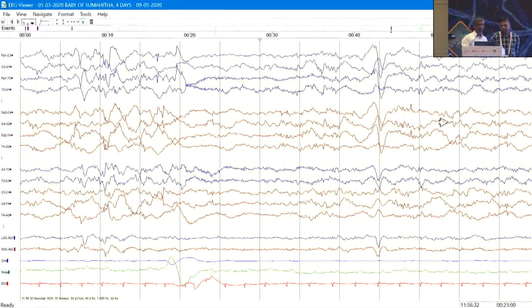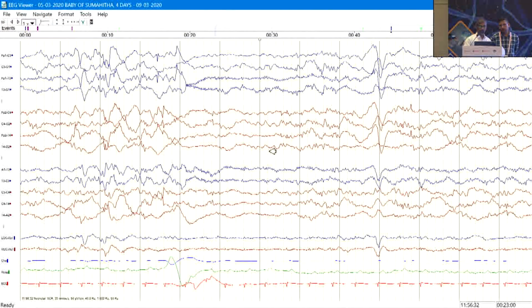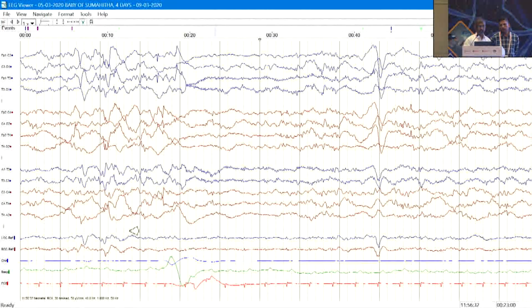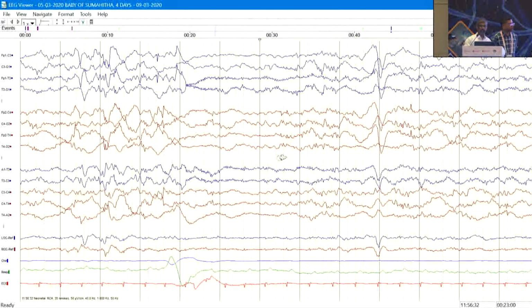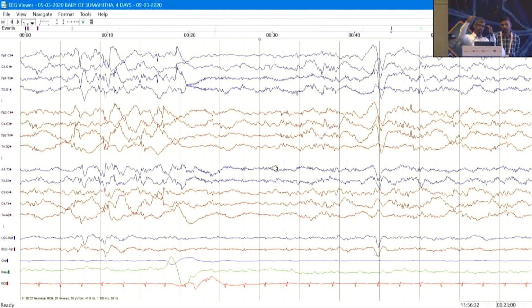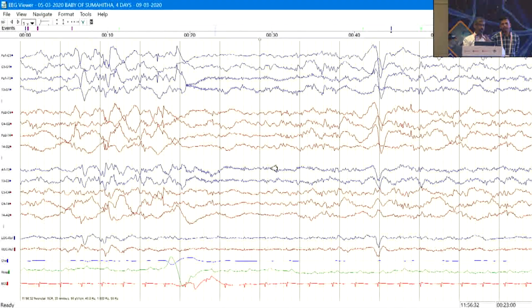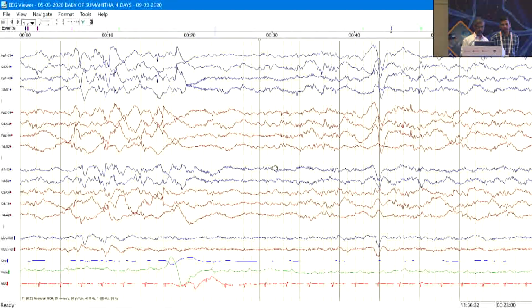Okay. Now looking at the discontinuity, this is 50 microvolt sensitivity. So look at this activity. Are they more than 25 microvolt or less than 25 microvolt? More than. Looks like more than 25 microvolt. The sensitivity is 50 here. Okay. Trace alternant. Yeah, and these are short interburst intervals, 3 seconds, 4 seconds, so shorter interburst interval, higher amplitude activity during the interburst interval, and bursts of activity, discontinuity. This is trace alternant. So this is more towards a term baby. So that's what we are seeing.